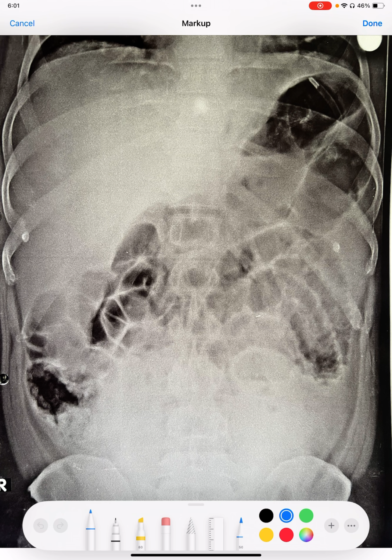The first and most important thing is, this is the diaphragm, right side of the diaphragm. We always know that this is left side and this is right side. This R is marked, means this is the right side. So this is all liver, and we know soft tissue appears radio dense or radio opaque. Opaque means white. So this white is all soft tissue. So here is all liver, which is a soft tissue. That is the reason why this is all white.